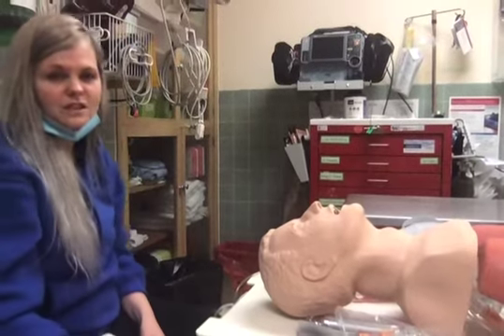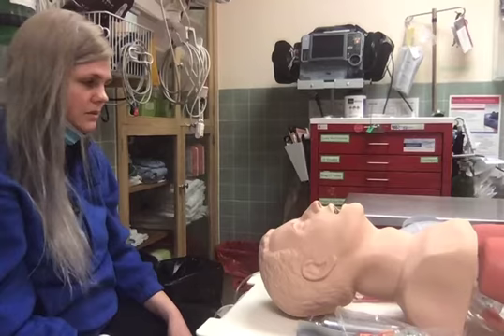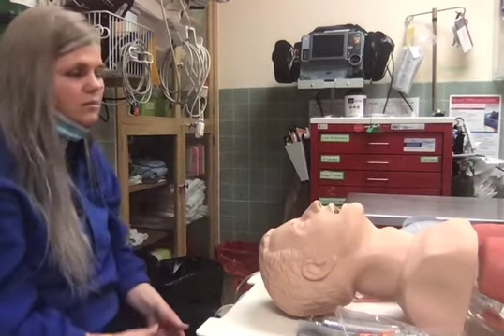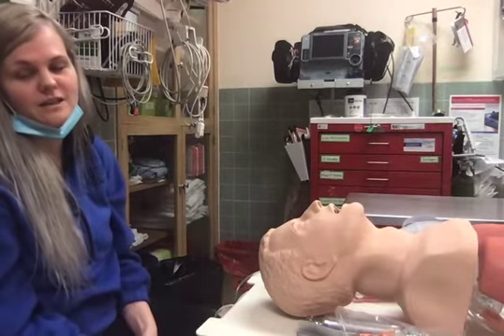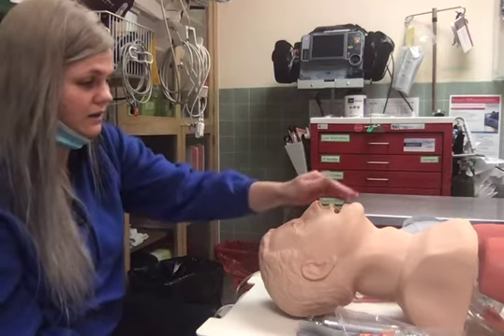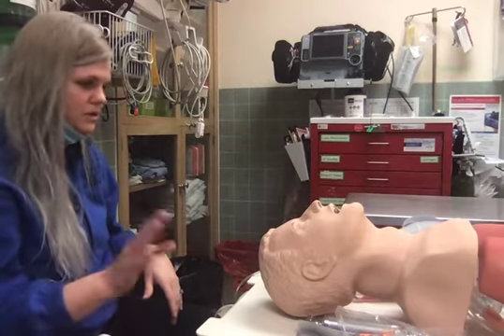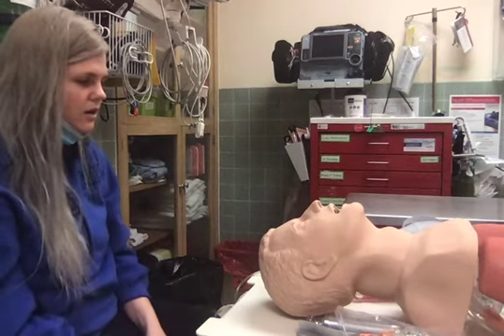And let's see here. So finishing up, we're going to talk a little bit more about ET tube placement, the actual intubation process. I'm not going to get into the RSI spiel because everyone does it very differently based upon your program, based on what you were taught. Essentially, like I say, how you were raised is how you're going to intubate. I like to go down the 7 P's, the pre-oxygenation, preparedness, that whole spiel, get your rescue airways, et cetera, et cetera. Again, I'm not going to go through all of that.